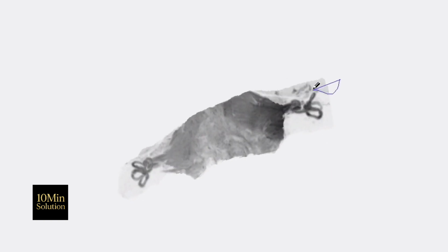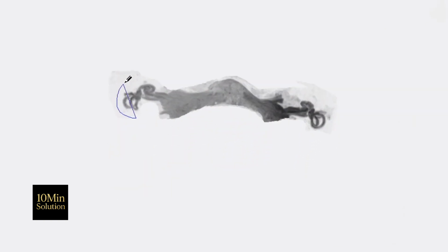Data loading and preparation. Post-processing begins by loading the raw MRI data into the workstation. Thin slice images around 0.5 to 1 millimeter should be selected. Carefully check for motion artifacts. Ensure proper orientation, usually in the axial plane. This step is critical as incorrect data selection can affect the entire analysis.